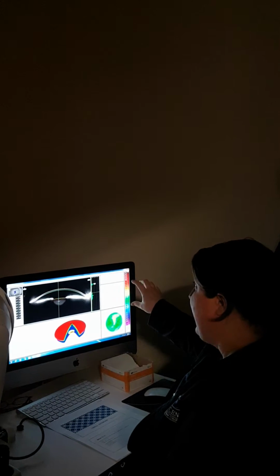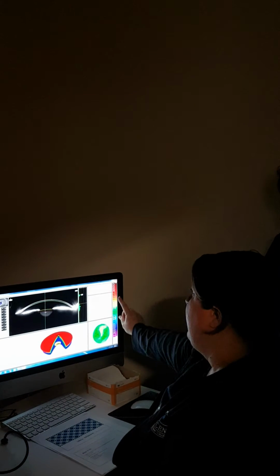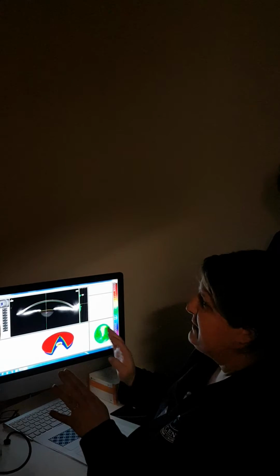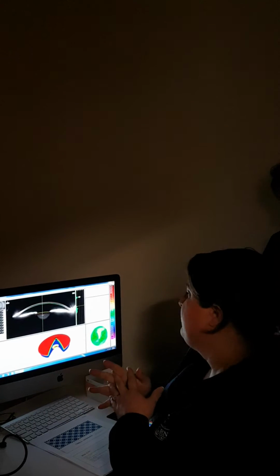But I can tell you again, when I have a PKP patient that I know is going to be a difficult refraction, I'm not going to start from the AR. I'm going to give my axis turned to this and to whatever this says, and I'm going to put my cylinder there. Okay, now the cylinder again may be totally off, but at least my axis should normally be in a pretty good position. Okay.